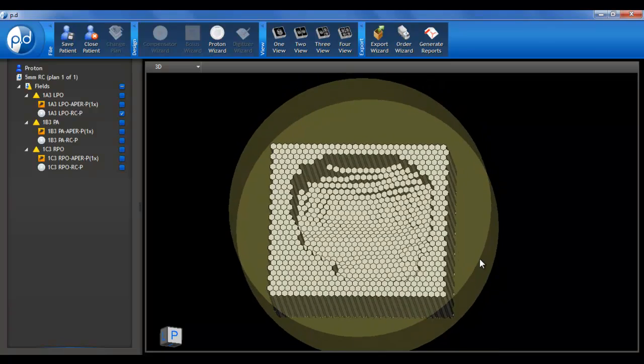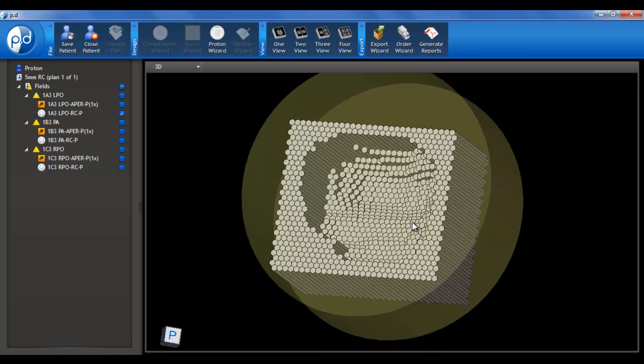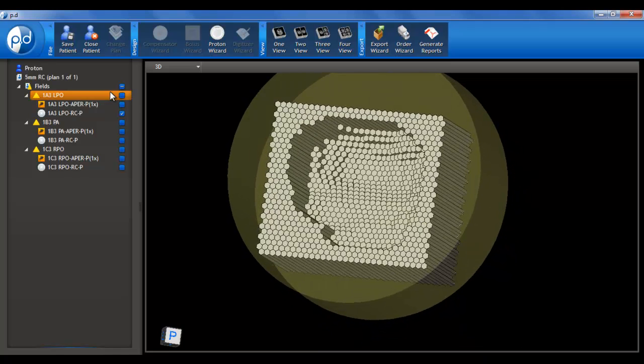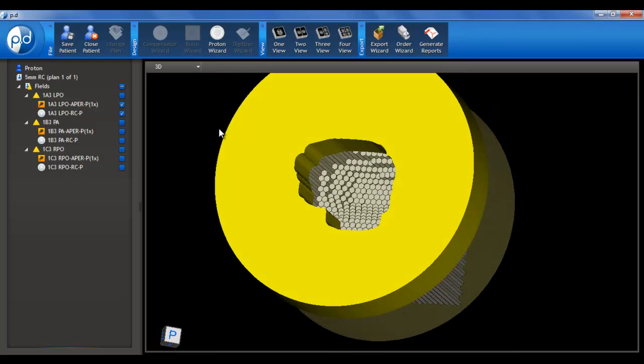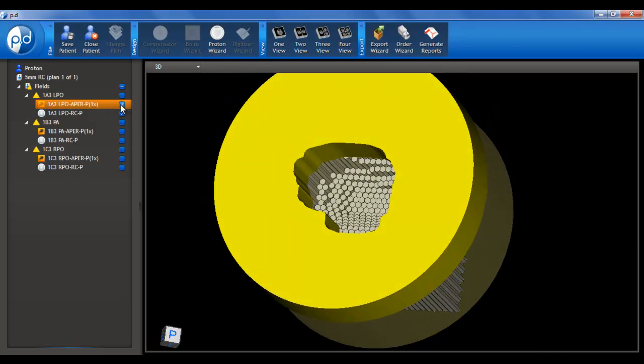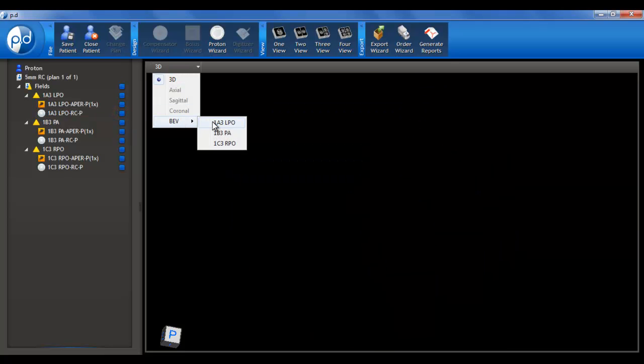Okay, so we can verify that the snout size setting is correct, that it's selected the correct blank size for our range compensator, and we can verify that the modulating surface looks as it was in our treatment planning system. We can also turn our block on with it and verify that the opening appears in the correct location relative to the compensator. And we can also do that in beam's eye view as well.